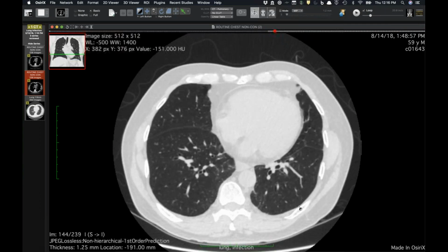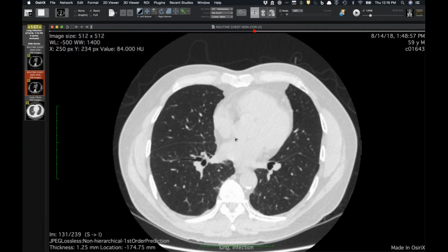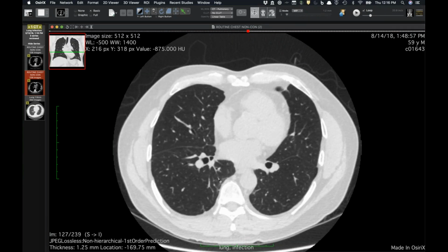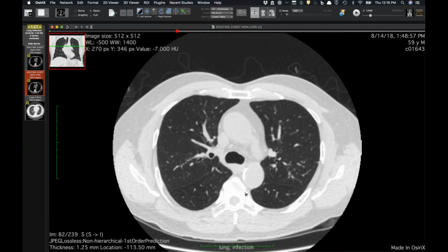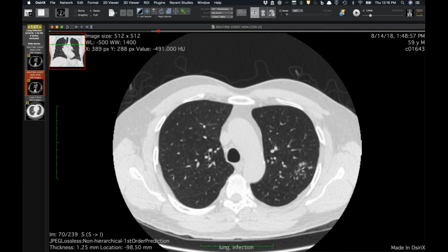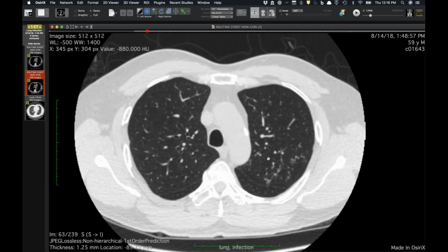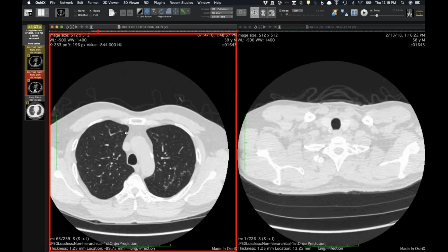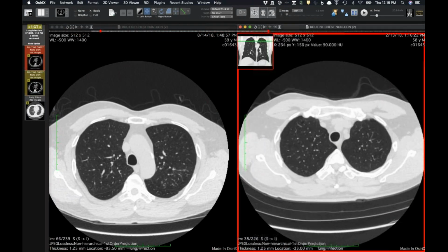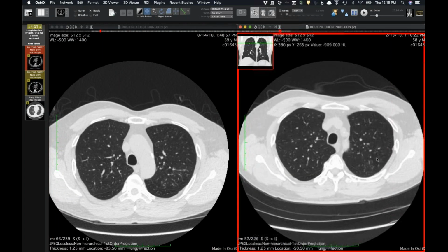This is one I saw last August. And this is a patient who has had a liver transplant. He had some focus of hepatocellular carcinoma. So he's getting surveillance CTs looking for metastatic disease. And I saw this, and he's got a cluster of nodules in the left upper lobe. And sometimes our restaging exams can get a little exciting. You look back and you see there's something faint there 6 months prior to that.